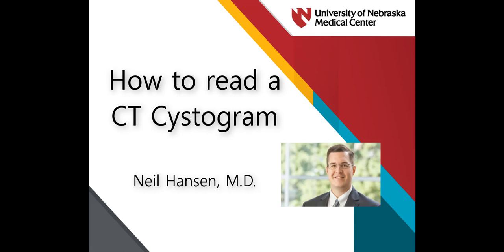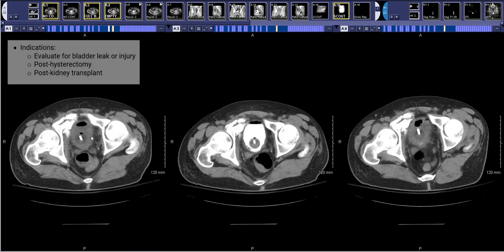Hi, this is Neil Hansen, and I'm taking you through a CT cystogram. So why would you get a CT cystogram? Well, usually it's to evaluate for a bladder leak or a bladder injury.